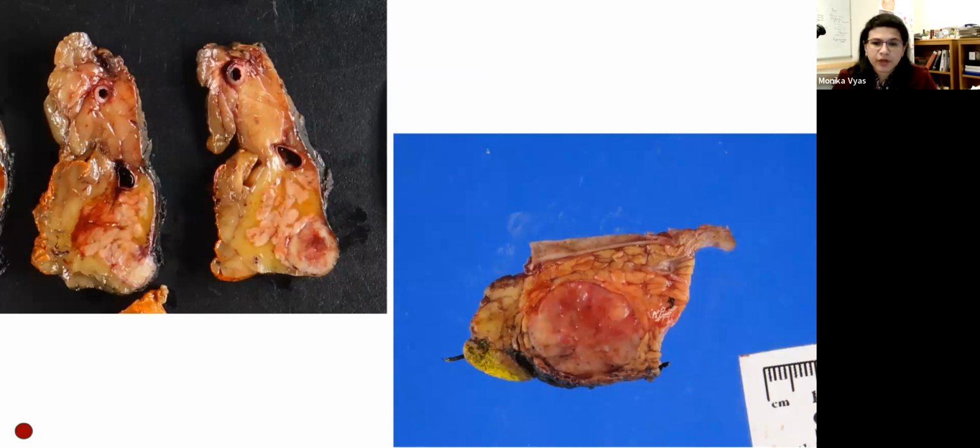All right. So moving on to resection of neuroendocrine tumors. These are a few examples here, and you can see a very well circumscribed lesion within the pancreatic parenchyma. These often have a fleshy appearance on cut section, which is pretty characteristic of neuroendocrine tumors. They can often be very yellow or whitish looking too, but with a very homogeneous cut surface. If they've had a prior biopsy procedure, or cystic degeneration in the center of the tumor, which has outgrown its supply, you can see central hemorrhage or necrosis sometimes.